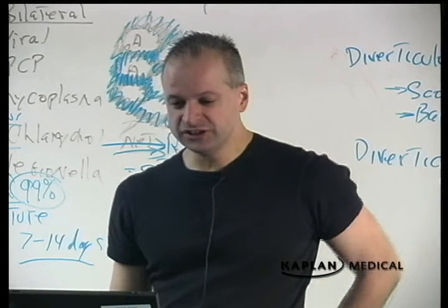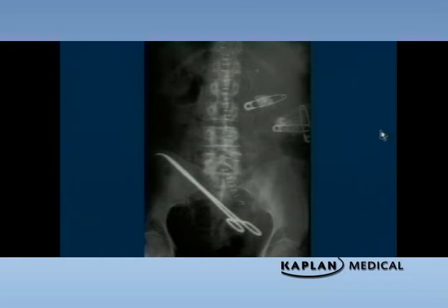The next patient, this is a picture of a lawsuit. This is a person who's had a clamp left in them. This is the patient who, as they were being stapled up from the abdominal surgery, must have said, "Hey doc, can you do me a favor?" "What?" "Can you leave an extra clamp in there? I could use the money." So this is a person who had a clamp retained inside their abdomen that's been stapled into them.